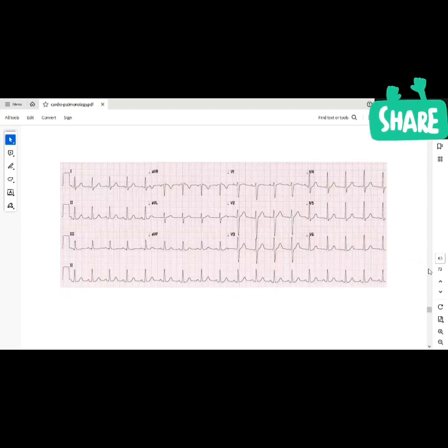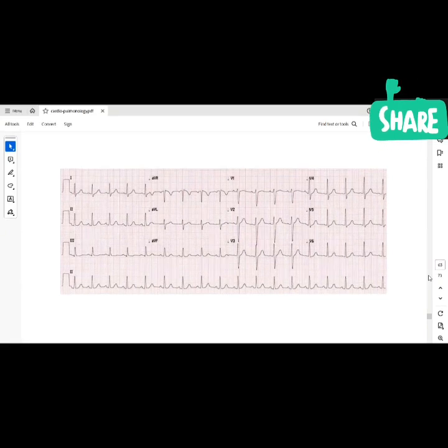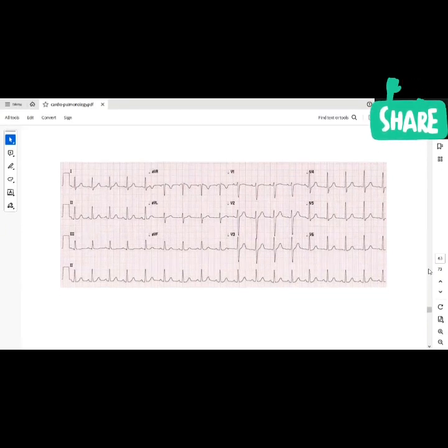...to arrhythmias, abnormal heart rhythms. So this is the normal ECG that I'm showing you now. How do we read this ECG? How do we read a normal ECG? There's a stepwise approach on how to read an ECG.